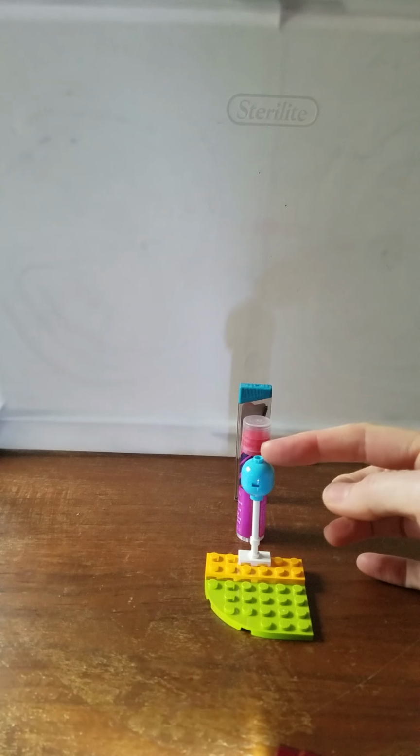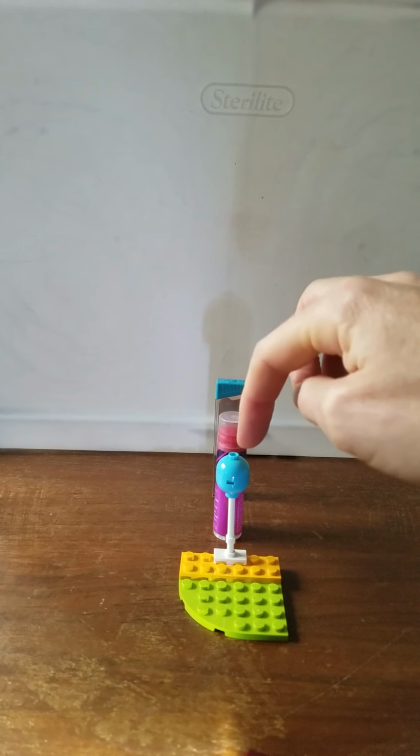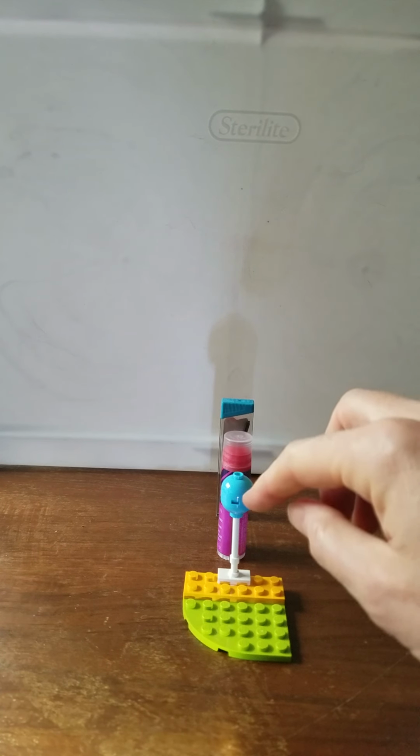So what we have here is a Buccal object. This little blue ball could be something like your zygomatic process. This could be buccal cusps. This could be the external oblique ridge, something that you know is always buccal, so you can observe how it moves.